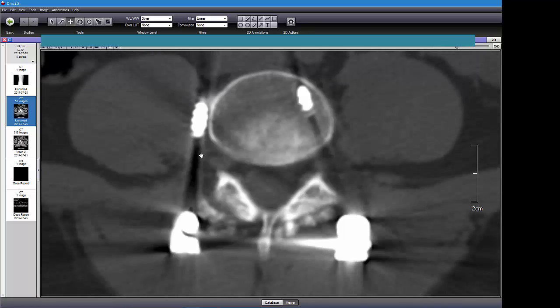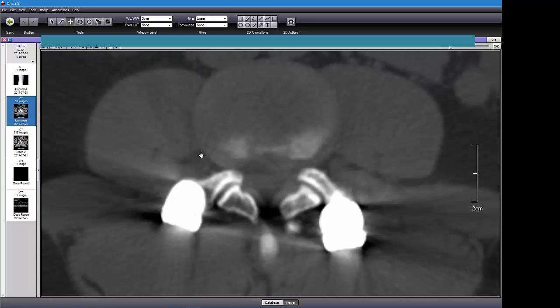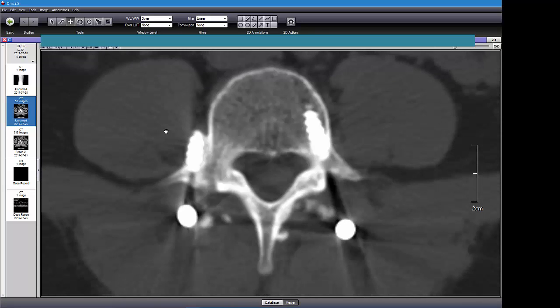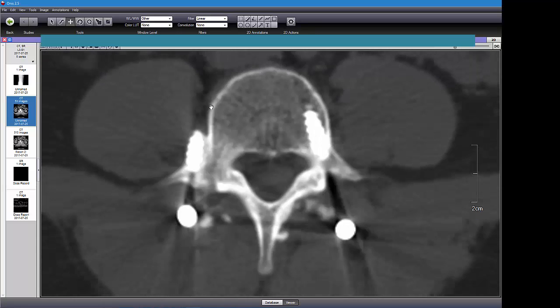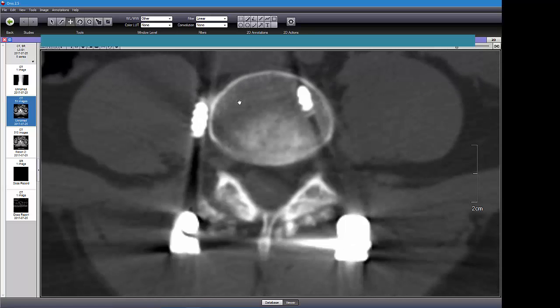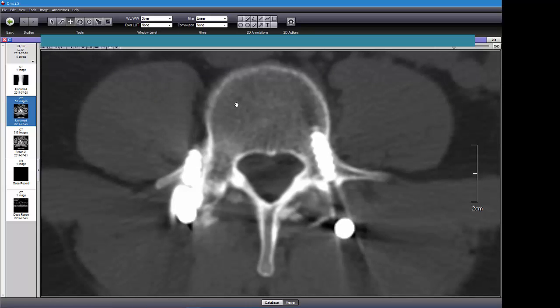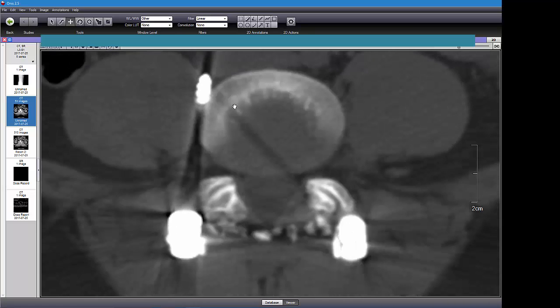So that's ridiculous. So you've got the L3 nerve root coming down, right? L3 nerve root. Let's see. It should be right in this region in here. Let's see if I can even see it. With an MRI we can see it, but we don't get a good picture of it here. But boy, it's sure off the mark.